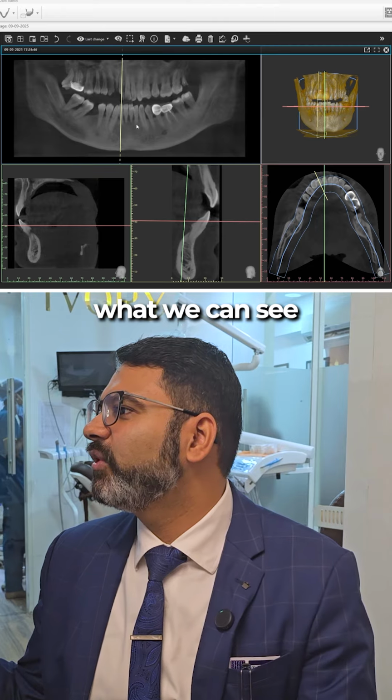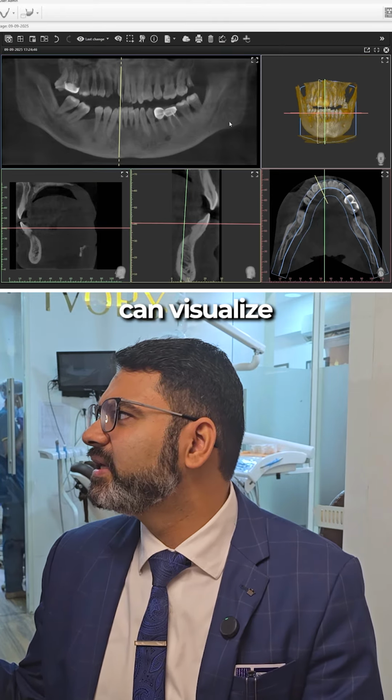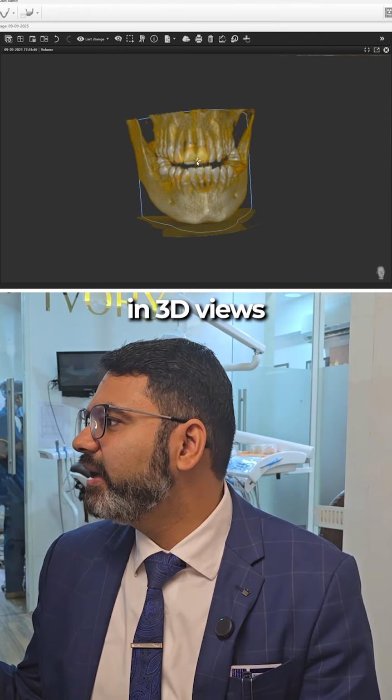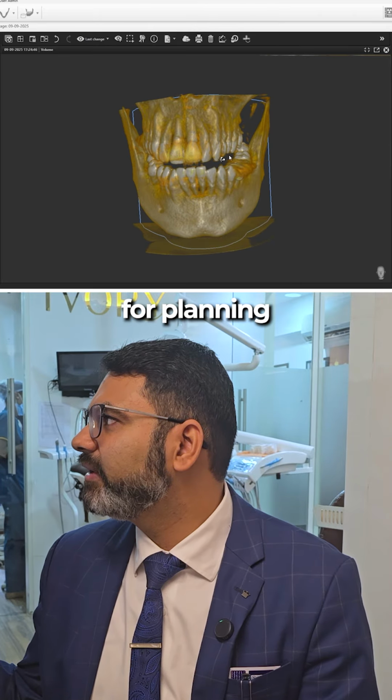So in this software, what we can see is now the whole dentition of the mouth in one go, and we can visualize the patient's bone condition and the gum condition in three-dimensional views. And we can take all the different sections which are required for planning for the implant.